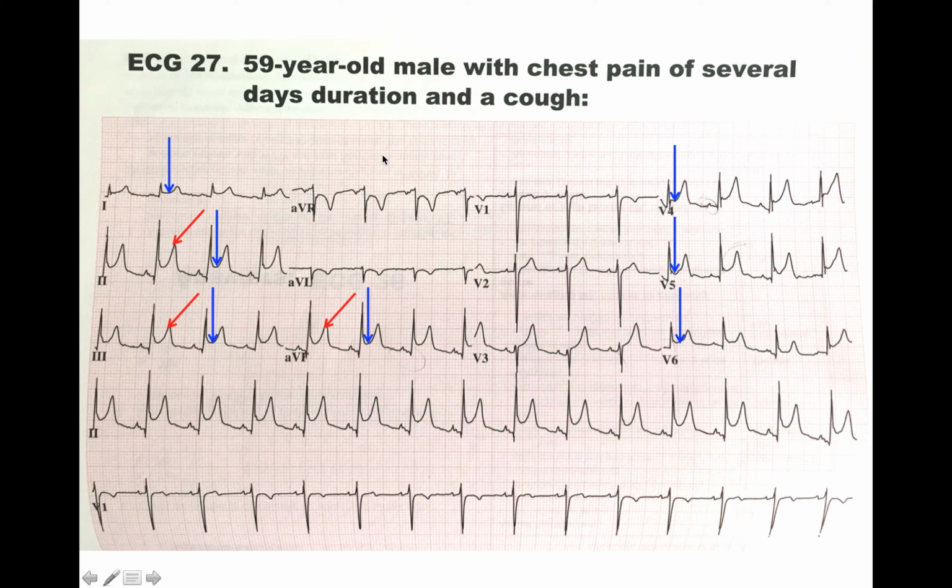And then pericarditis often takes a stage approach to the changes that you'll see in an EKG. There's generally 4 stages. The first stage, you can see ST elevation in almost all the leads, as you see in this pattern. And then stage 2, the J point, the ST junction, begins to decrease and return a little bit closer to baseline.